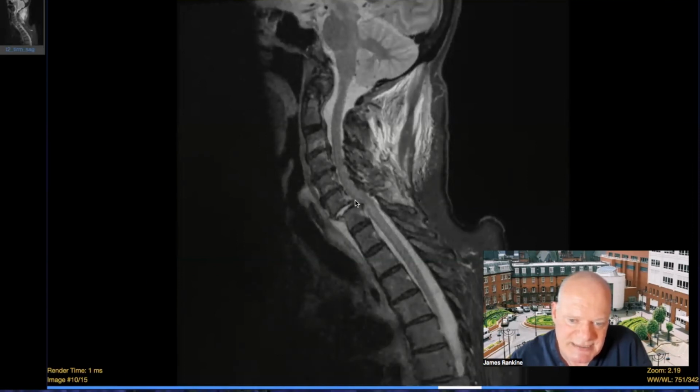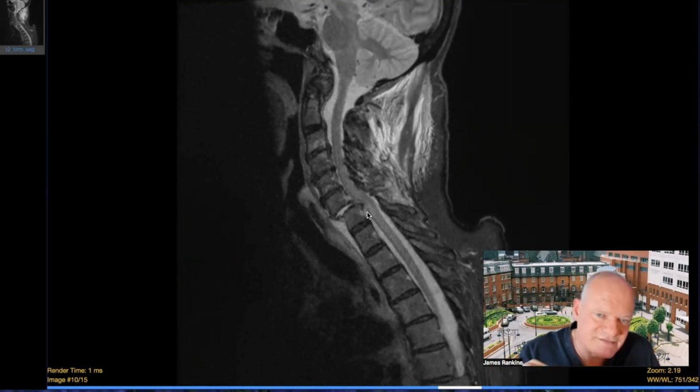So this is the most unstable form of injury because nothing is connecting this portion of the spine to this portion of the spine. So the take-home message for this case is that no matter how small the fractures of the facet joints, if they are horizontally orientated, they are very significant because they're caused by flexion injuries.